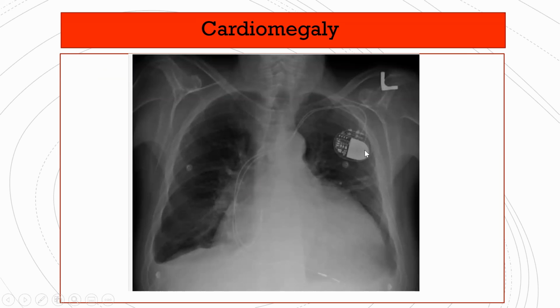And what else can you see here? If anyone wants to say in the chat, just fire away. You can see some little probes here. These are actually not in the patient, they're on the patient. These are ECG leads that are on the patient like this. You know when you monitor a patient in HD or in IT, you have permanently on their chest some little ECG leads. And then here you have a pacemaker.